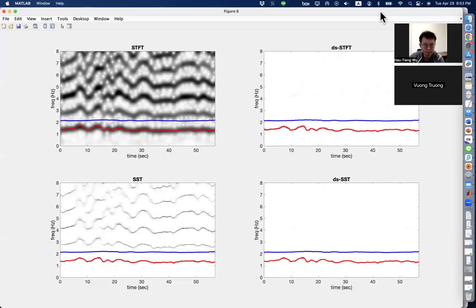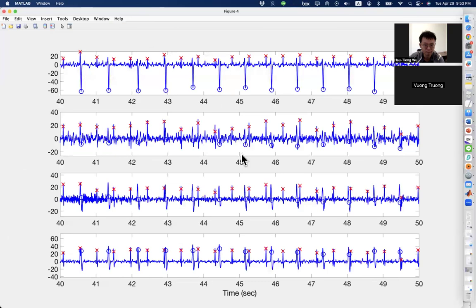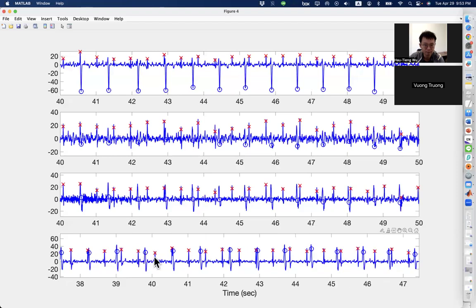Okay, very good. So now let's take another look. This is the first channel that we observed before. In this case, you see, although we can see the fetal ECG, it is relatively weak. That is why you don't see too much. But in this channel, the magic is, well, not really magic, but fetal ECG is stronger, much stronger.